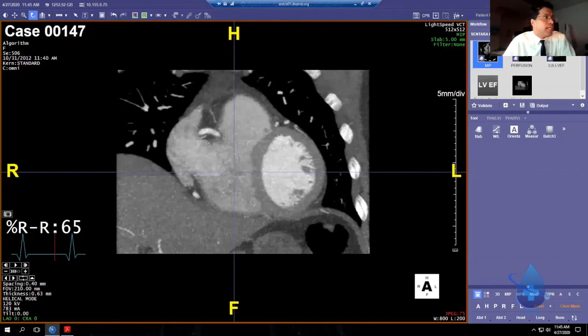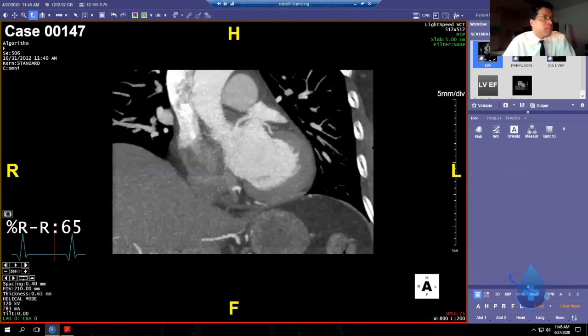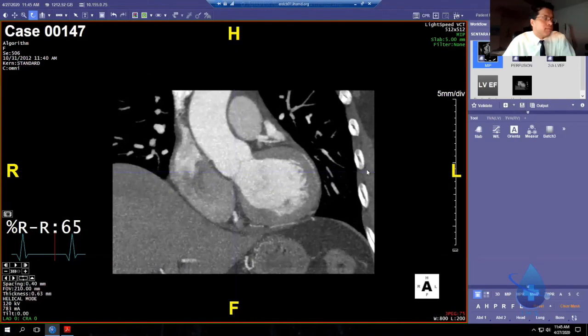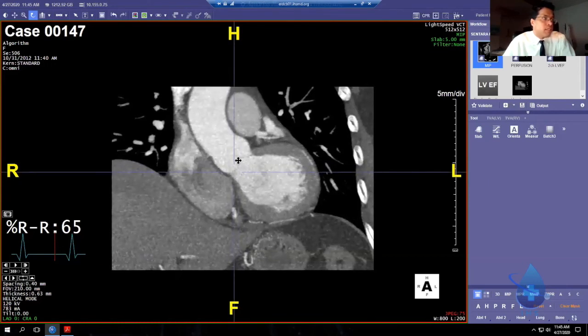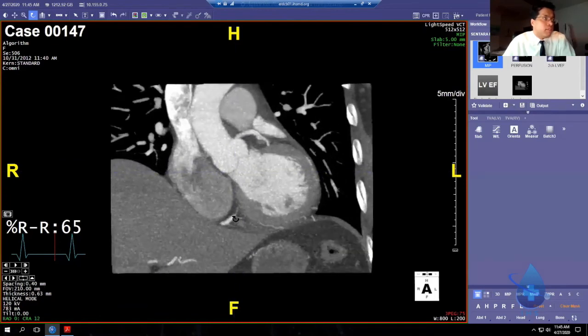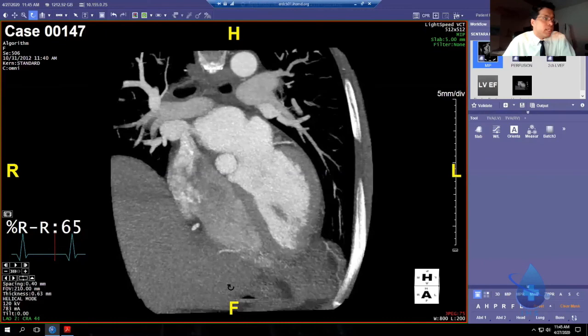First thing, find the aortic valve. It is your home position. If you can find the aortic valve, put it in your crosshair. Next, part 2 is to orient it so that the septum is aimed north and south down the crosshair. How do you do that? You left click and rotate inferiorly.